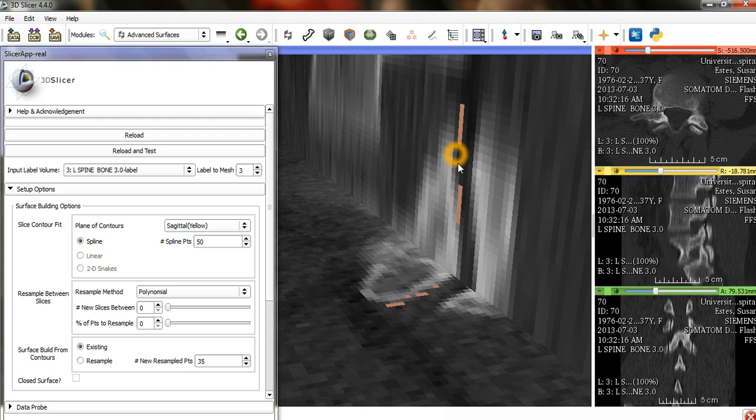You'll notice that it's sparsely labeled, and they're kind of like lines here in this sagittal plane, the parasagittal plane here. And that's because the slice thickness in the axial direction is large, and so the length of this represents the slice thickness. And so you can't actually pick a point off, although that's kind of what we'd like to do. So that's kind of why it looks sloppy, but we'll just kind of go forward with it from this point.